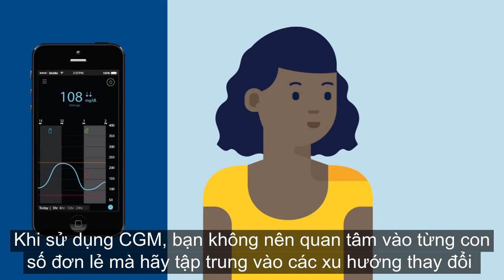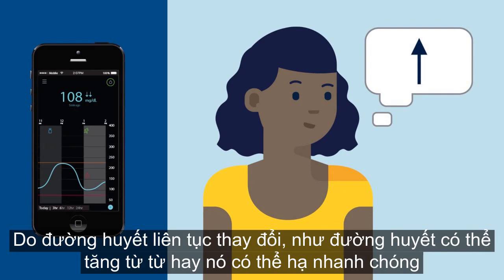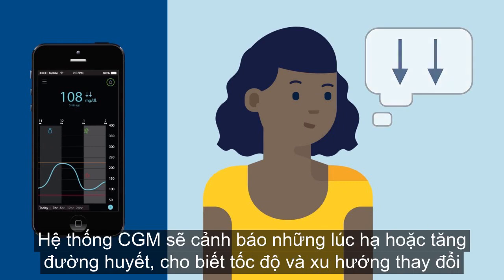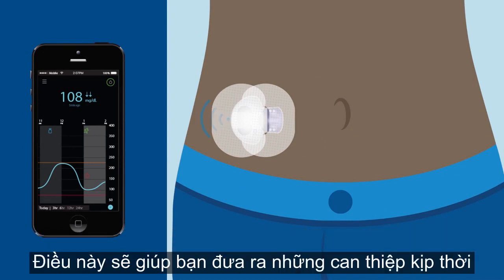since your glucose constantly changes. Is your glucose rising slowly, or is it falling rapidly? Your CGM system can alert you on your high and low glucose values and show you the speed and direction that your glucose levels are moving, giving you time to take action if needed.